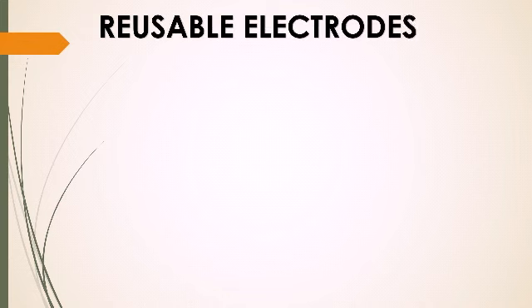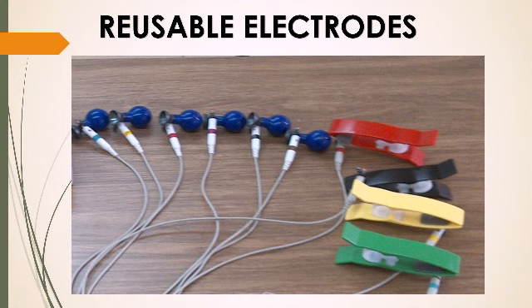The other electrodes are reusable electrodes. You use them more than once. Use them on one patient, you clean them, and then reuse them on another patient. These kinds of electrodes are reusable.